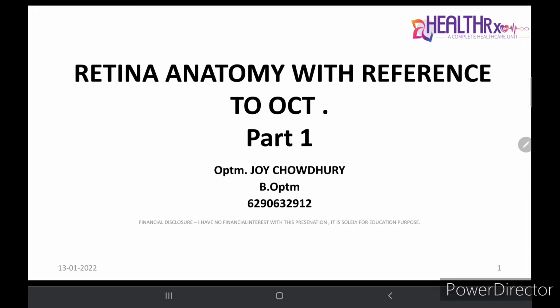Today the topic of discussion is retinal anatomy with respect to OCT cross section.